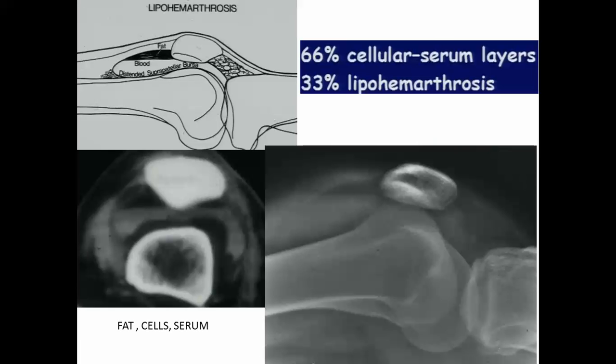The principle of the fluid level is due to serum and lipohemoarthrosis, fat and blood.